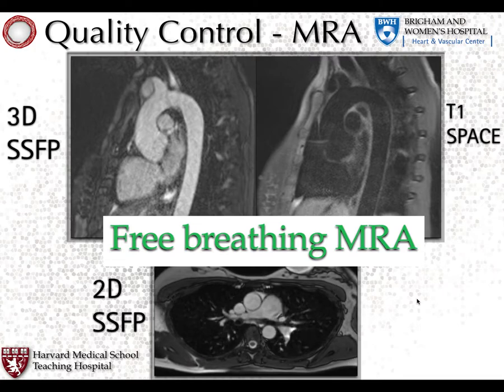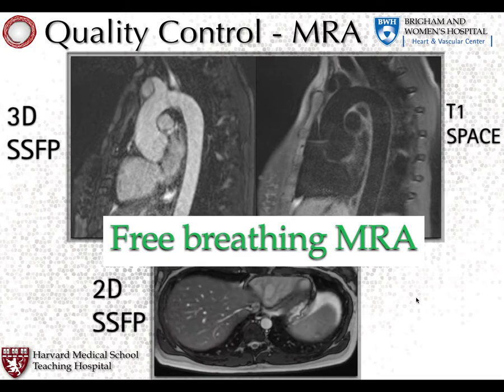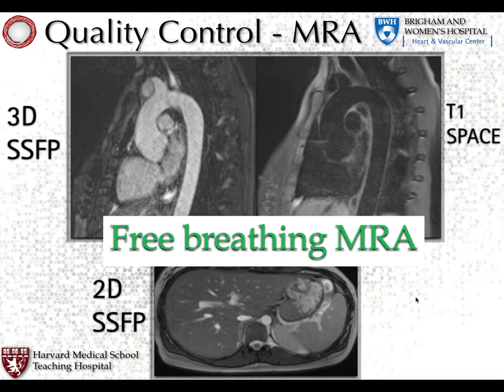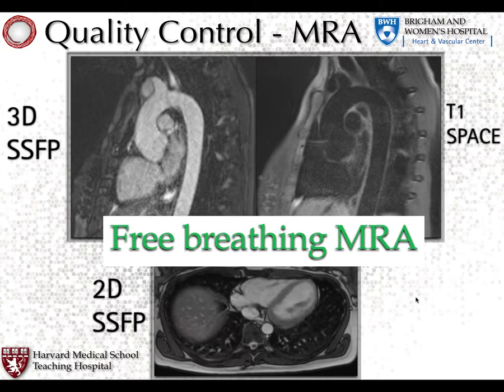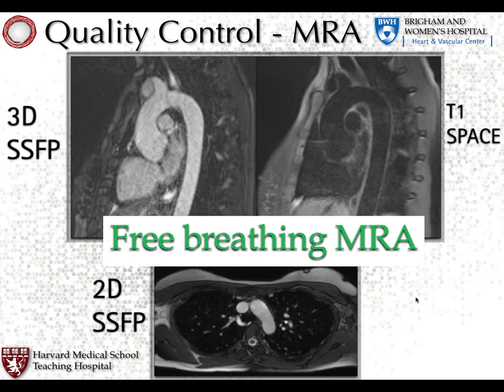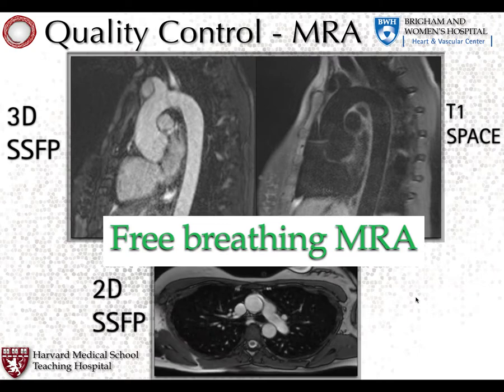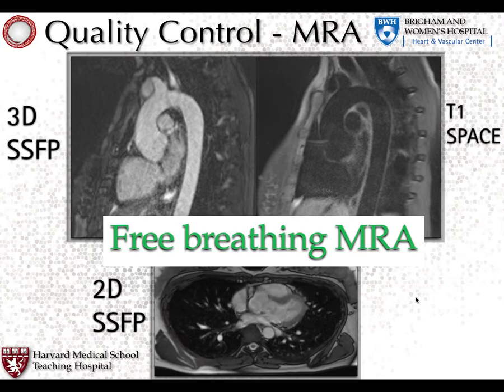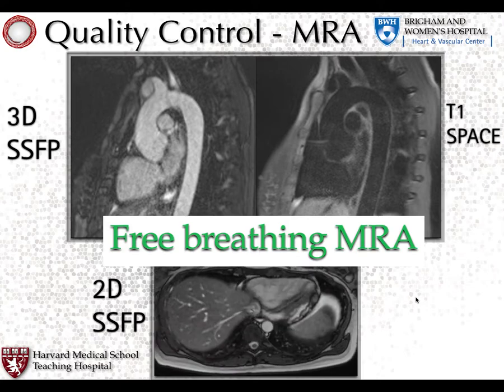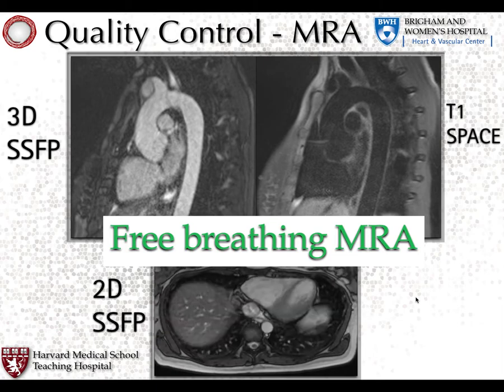With SSFP, during systole, you have high flow. Actually, it's a method that's used to do non-contrast MRA. They do SSFP, gated, and do a subtraction, systole versus diastole. They use the difference in signal between systole and diastole, and that's how they do the subtraction. But it's gated, so if your gating doesn't work, that doesn't work. But yeah, that's another reason to do it gated, to do it with fewer artifacts.